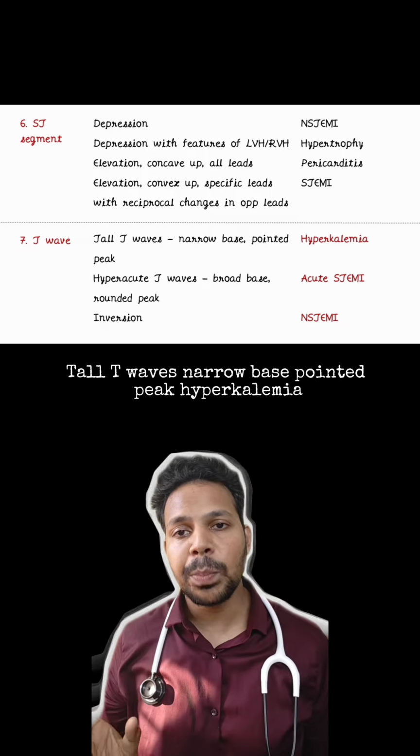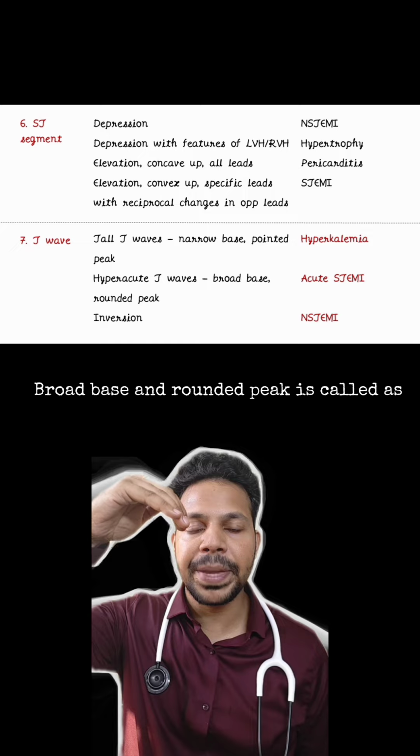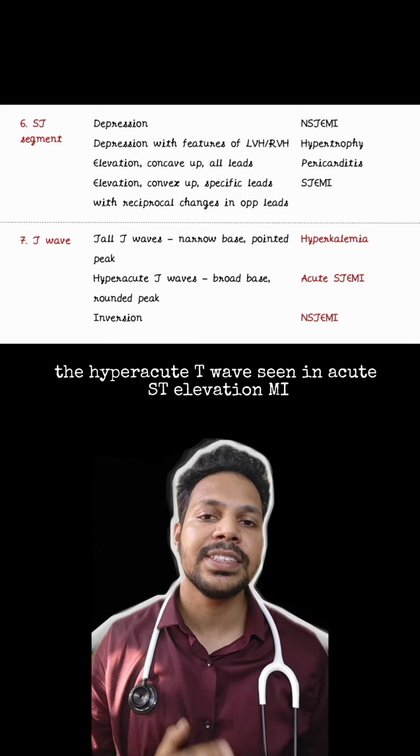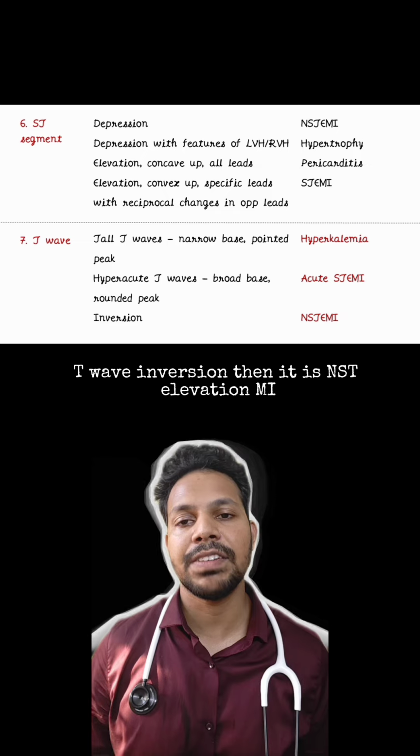Then T wave. Tall T waves, narrow base, pointed peak, hyperkalemia. Broad base and rounded peak is called the hyperacute T wave seen in acute ST elevation MI. T wave inversion, then it is NSTEMI.